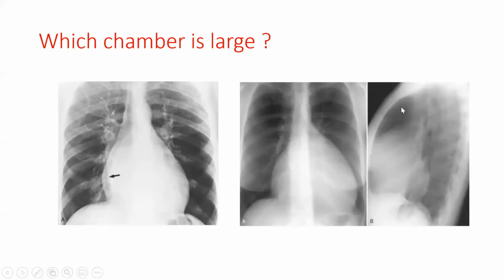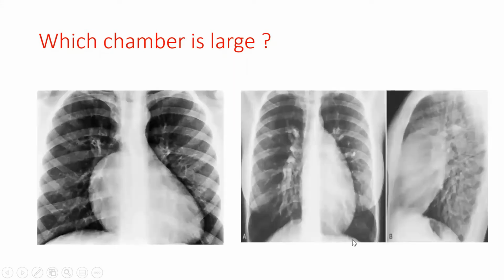And in the lateral X-ray, you see that the remaining aerated part of the lung is small. Now you see here it's occupying more than 2/3. Usually it occupies less than that. This is the right side, the right ventricle. So if it was the right ventricle, we see that the dilatation is in this direction. So this is RV dilatation.